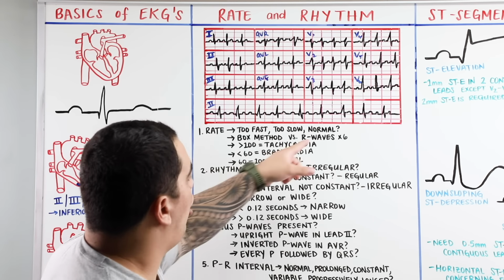Do they have variable block? So atrial flutter with a variable block. Whereas if you guys remember here, with narrow regular, it could be a 2-to-1 atrial flutter, and that produces a narrow regular tachycardia. But if it's atrial flutter with a variable block, that can produce a narrow and irregular tachycardia, okay? So AFib, variable atrial flutter, and multifocal atrial tachycardia should be your differential for narrow, irregular tachycardia. What if you're tachycardic, you're going too fast, you have a regular rhythm, but you have a wide QRS?